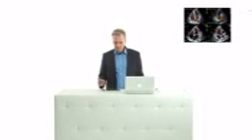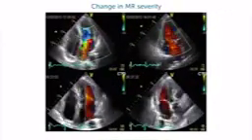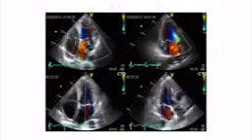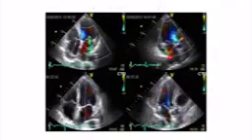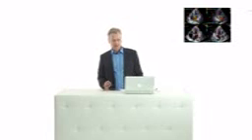Here's an example that demonstrates that. A patient who was on chemotherapy, and the 2 top images show the echo that was performed during chemotherapy, probably due to some subclinical form of left ventricular dysfunction, and maybe even to volume overload. This patient now has relatively severe mitral regurgitation. Clearly there's jet here and here. And then after only 5 weeks, the patient came back and almost no regurgitation was seen. So keep this in mind. Regurgitation is something, especially in functional regurgitation, that comes and goes.